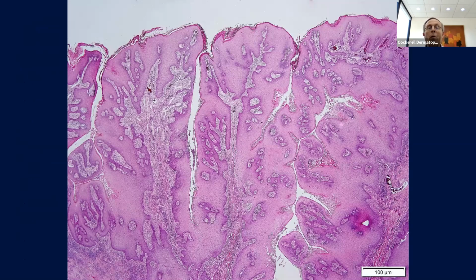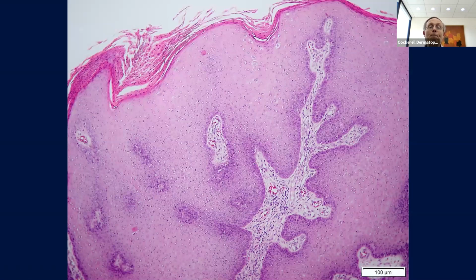Okay, another verrucous lesion. This one is a deep saucerization or incisional biopsy. This goes really deep. But if you just had a superficial shave like this, what's the best diagnosis? It looks like a wart. So if you don't get a deep biopsy of this entity, you're never going to get the diagnosis. If you keep submitting it in with a superficial shave biopsy, you're going to get back wart, wart, wart. But unfortunately, for the patient, this isn't just a wart.